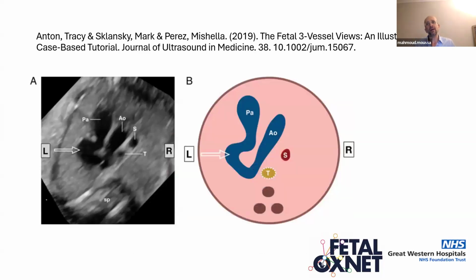And here is another thing. I didn't have a clip for it recently, but we see it quite a lot, though we do not really take a lot of clips for it. That's a normal variant as well, which is the tortuous ductus arteriosus, and sometimes it might be slightly dilated, which we call an aneurysm of the ductus arteriosus. The tortuous ductus arteriosus, especially in the 3rd trimester, is a completely benign and normal variant, and we wouldn't necessarily do anything different when we see it. So again, that's another normal variant you can get in your 3-vessel trachea view.